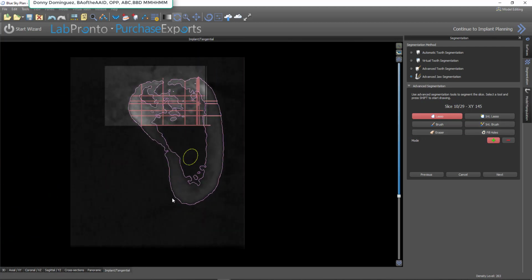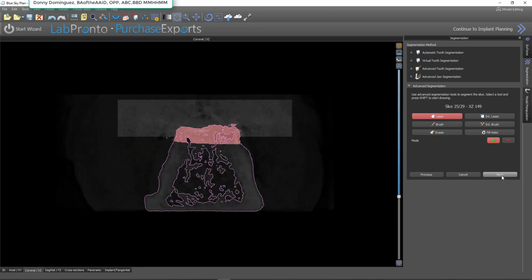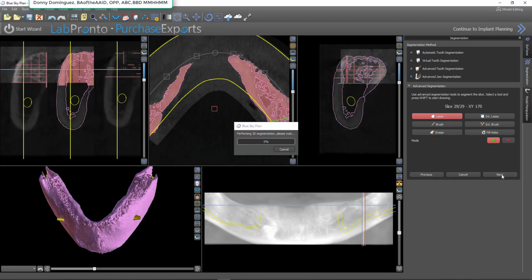Alright, I'm probably beating a dead horse. I'm pretty confident on a mandible like this that we've got more than enough data to do a really nice job. I'm trying to give you a demonstration of how I would do this without having to depend so heavily on Mesh Mixer, because I know many people are averse to that. Just to make absolutely certain it's the best it can be, I'm also going to take what I think will be a perfectly fine segmentation and combine it with this other one.